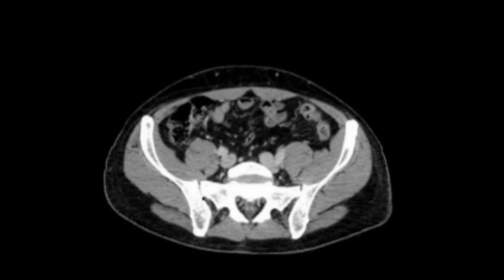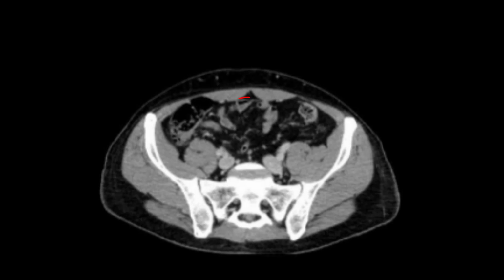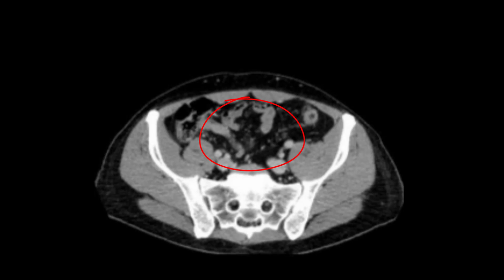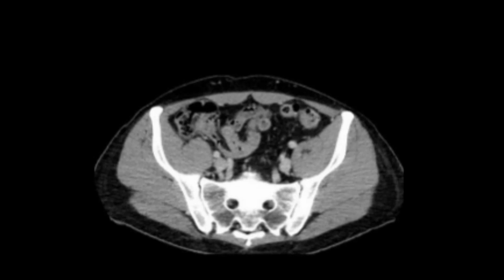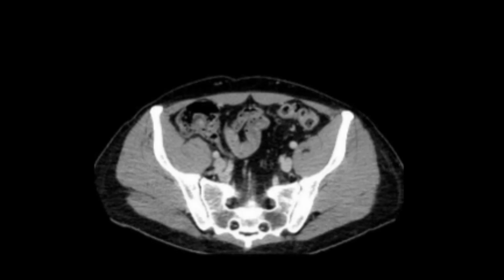The lower part of the abdomen is filled by the loops of the ileum. So this part of the small intestine is ileum. It opens into the cecum at the ileocecal junction, which you see right now here. And you even can see the appendicular process on this image. Have a look, this tiny guy here is the one.